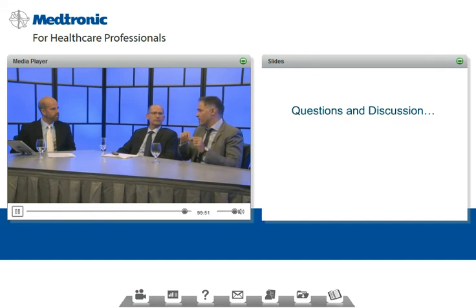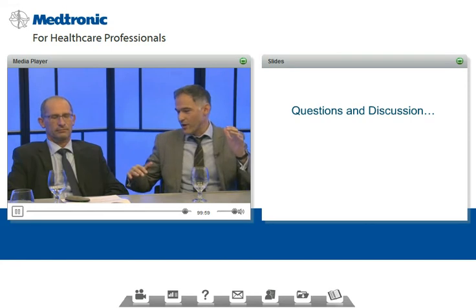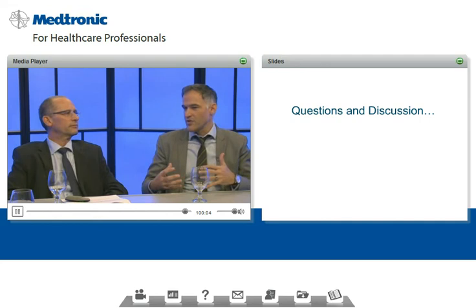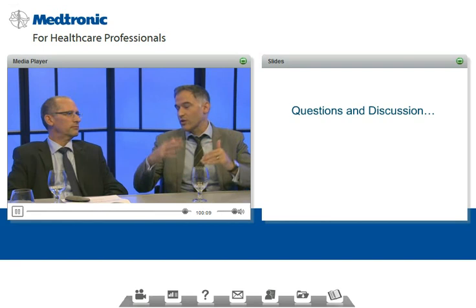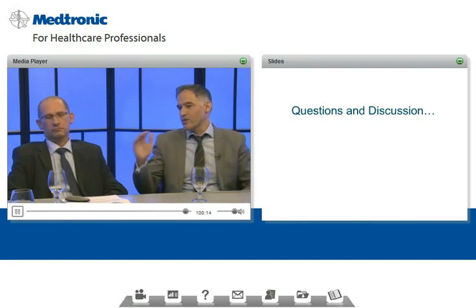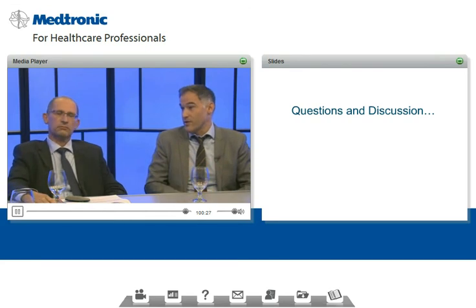Just like when I look at the basal profile, my quick screen is roughly those hours of 3 a.m. to 9 a.m. Do they generally have their higher rates there, rather than noon to 5 when I expect them to be lowest? So it gives me things to see at face value. It gives me a starting point. So with a patient who doesn't have that higher basal overnight and is struggling with fasting hyperglycemia, I know that's probably one of the reasons. Or they have their highest rates in the afternoon and they're struggling with afternoon hypoglycemia, I know that's probably one of the reasons. And the basal split gives me an idea of that as well. So it just starts me thinking about the patient.